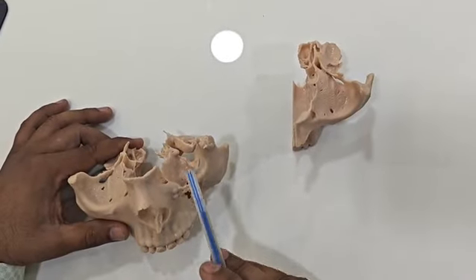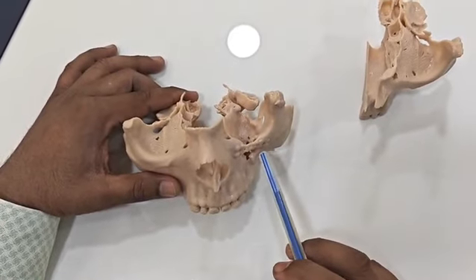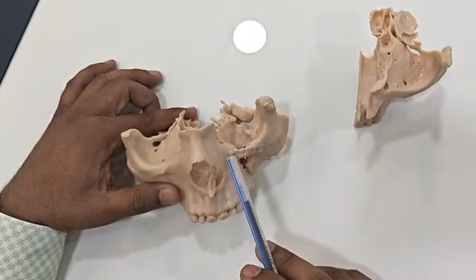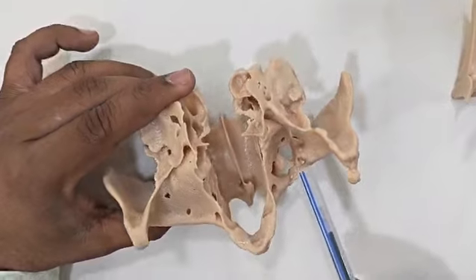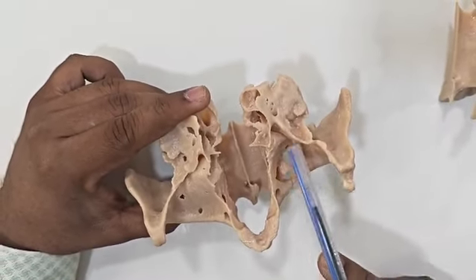Okay, this is a 3D reconstructive model of one of our patients. The patient came to us with unequal pupillary level, and if you can see, this patient has been operated almost a year back with titanium plates and screws. If you look very closely and compare with the right side, there is a major orbital blowout fracture.